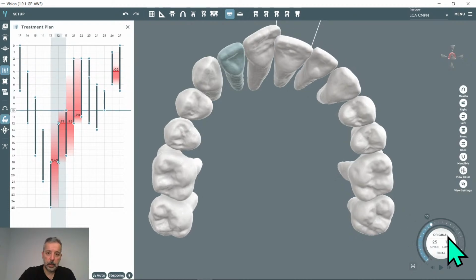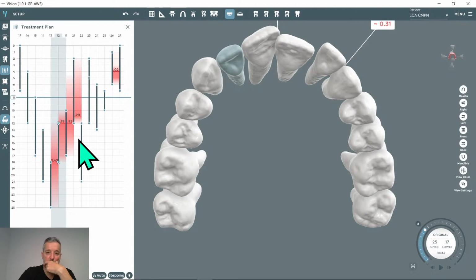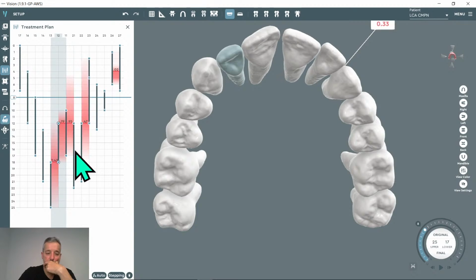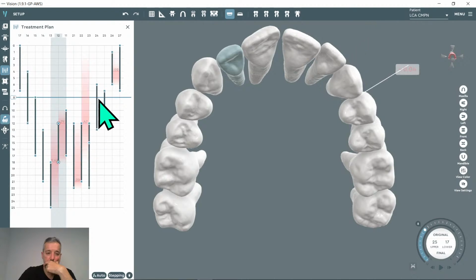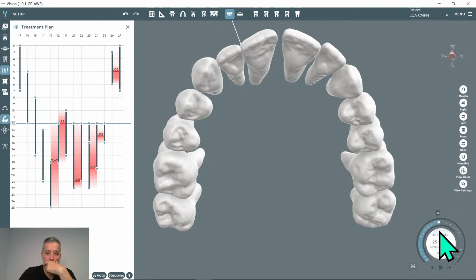No, look, now we have collision here, and you need to change also this time, for example, and also this time, and also this time, and this time, this one, and this one maybe. No, this one not, maybe, and also look like this.